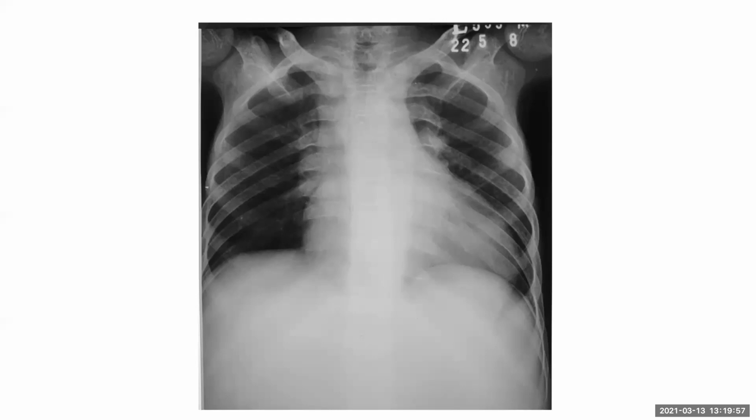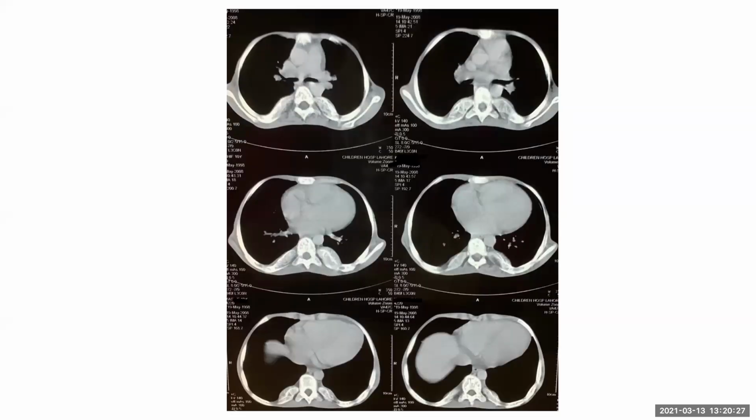But I'm also looking at the humerus head and also looking at the splenic shadow. I'll arrange for an echo to look for any cardiac anomalies, and also arrange for a hematology panel to look for any hematological disorders like sickle cell anemia or thalassemia. Okay. This was the CT scan patient.